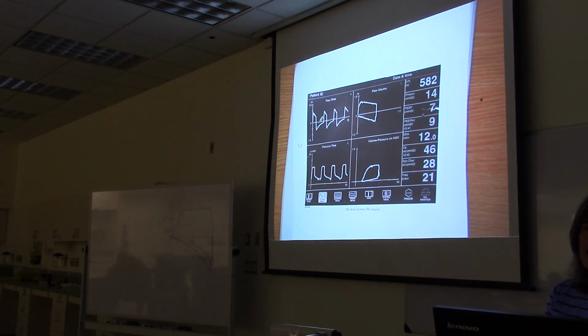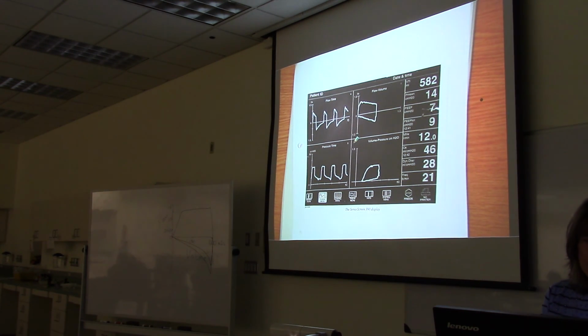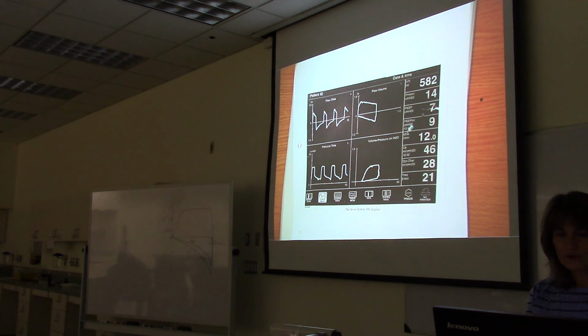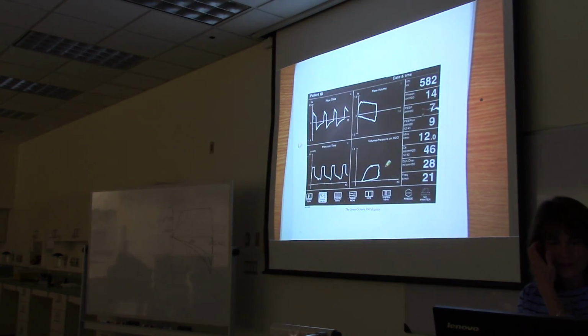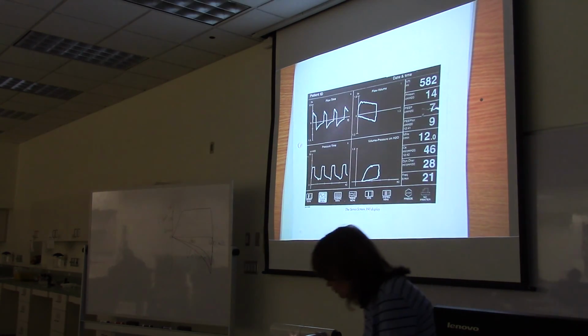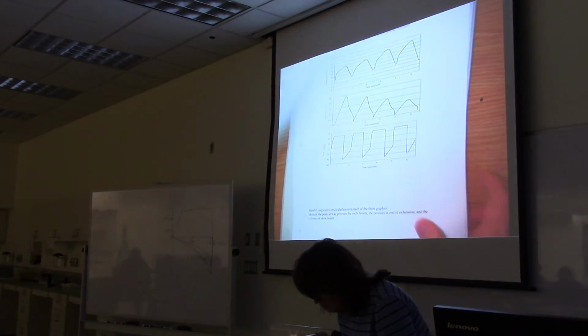So this is a pressure time scalar, just showing the pressure building during inspiration and then exhalation. And then your loops, your flow volume loop, and your hysteresis curve. Okay, I think that was the last page, or is there more? Yeah, that was the last page.